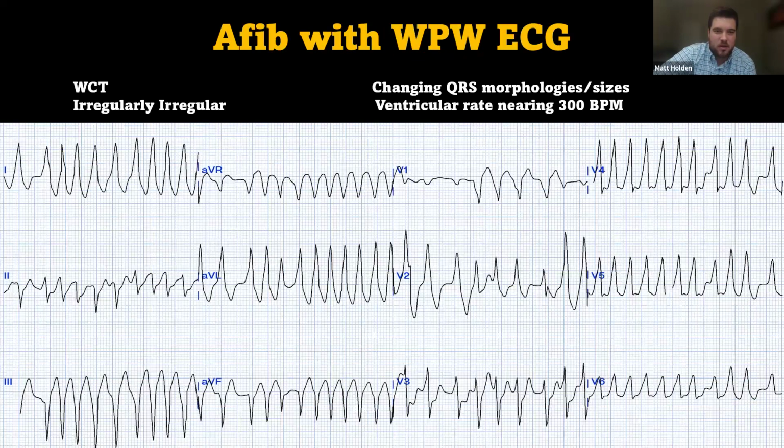Now, here's something from when I was doing my rotations in paramedic school. They showed me this 12 lead and I kept it for a long, long time. I was like, oh, this is a really interesting, cool 12 lead. They called it, what do you think these people called this? Does anyone know what they called this initially? Torsades. Yes, they called this torsades.